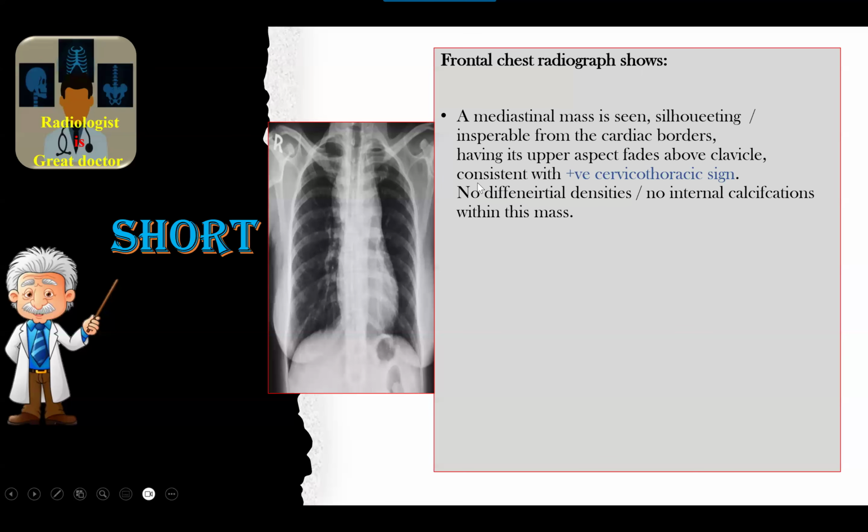Regarding the negative, complete the report. What do I mean by complete the report? Normal heart, normal bones, no pulmonary nodules. This is the rest of the report. It's a short report. No pulmonary masses, no bony lesions. Cardiac size is not enlarged, because sometimes it's borderline and I don't know if normal or not. This wording is better: cardiac size is not enlarged. Okay, this is good regarding the report.